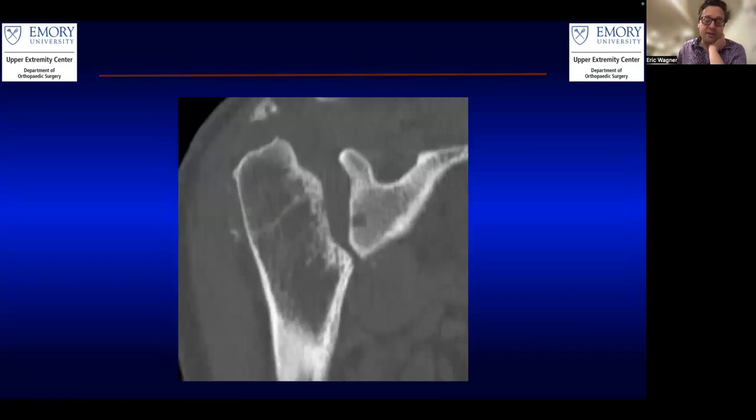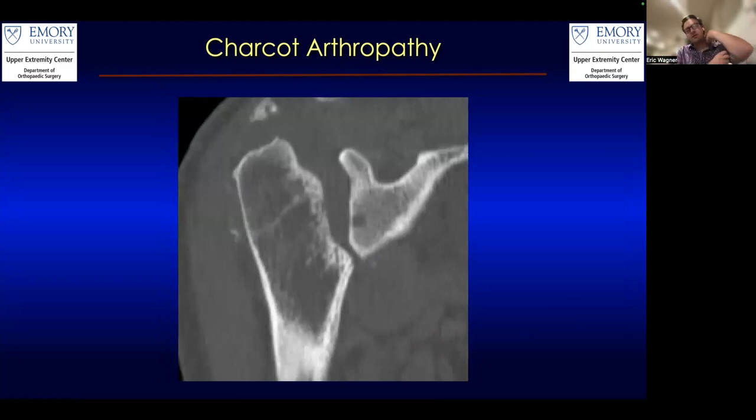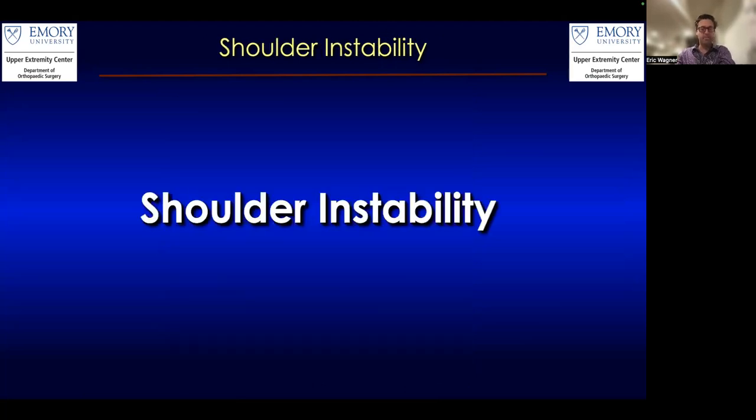And then this looks bad. So this could be Charcot arthropathy. It could be chronic kidney disease. Not sure. You definitely want to rule out the neck. You definitely want to rule out any type of bad uncontrolled diabetes. You want to rule out chronic kidney disease. Infection is an important one. So I would aspirate. I'd get an MRI of the C-spine. A variety of different ways to rule out something going on here because this is bad. Getting this bad of shoulder arthritis is not common.